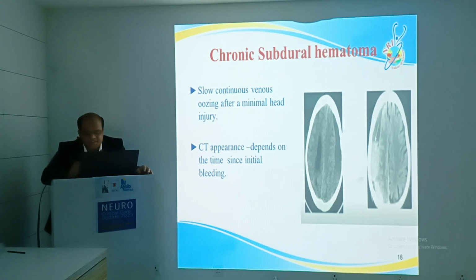When we got a CT, the CT showed like this. This is what we call the second CT, where both the white as well as darkness is there. That is acute on chronic SDH. This is continuous, because if you compare this density with the CSF, it's not such a black, but relatively less than that. It's a chronic SDH.